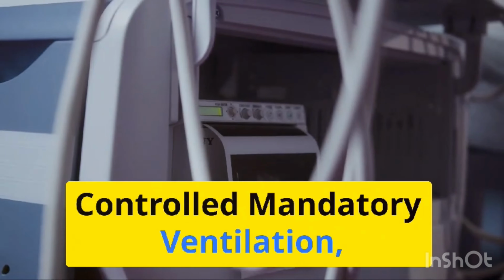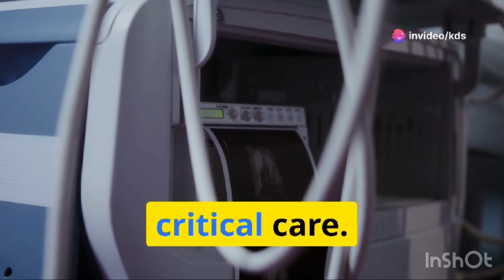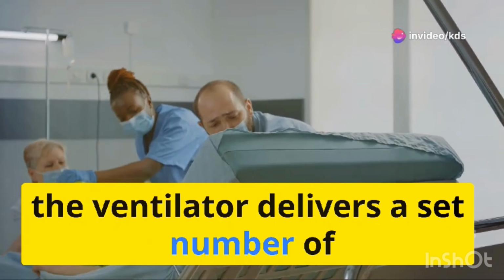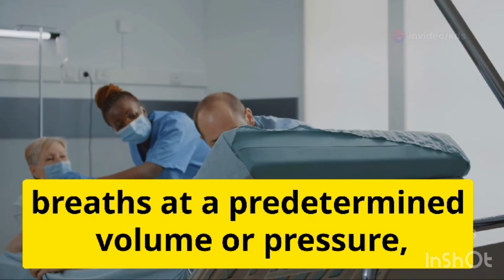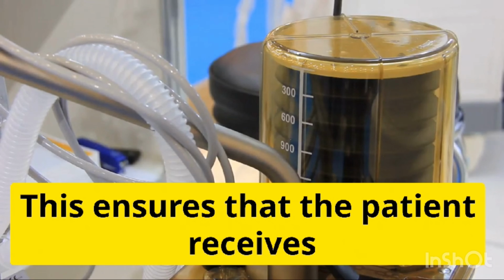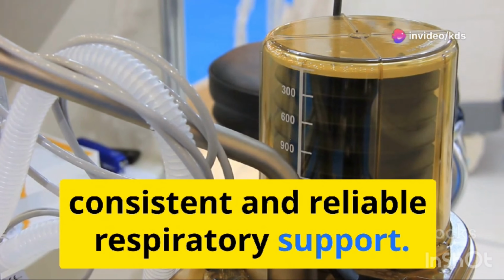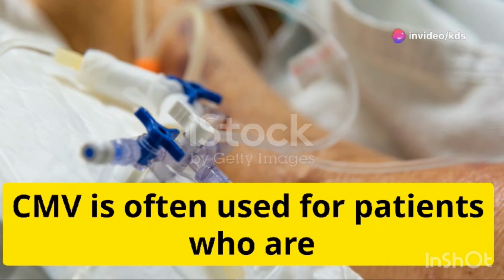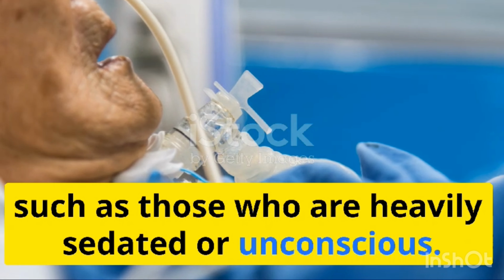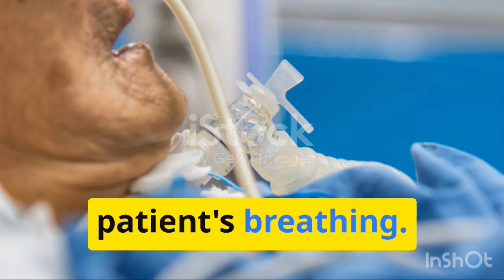Controlled mandatory ventilation, or CMV, is one of the fundamental modes used in critical care. In this mode, the ventilator delivers a set number of breaths at a predetermined volume or pressure, regardless of the patient's effort. This ensures that the patient receives consistent and reliable respiratory support. CMV is often used for patients who are unable to breathe on their own, such as those who are heavily sedated or unconscious. It provides complete control over the patient's breathing.